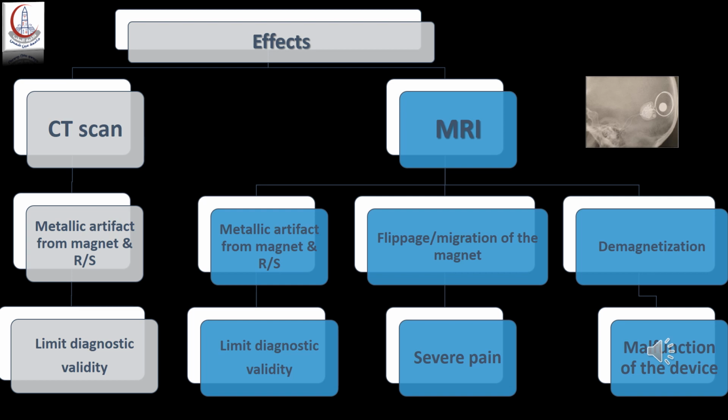In patients undergoing MRI, the problems are much more complex. The metallic artifact will cast a large shadow on the side of the head and the brain, definitely, and it can obscure pathologies and limit the diagnostic possibilities of the MRI.